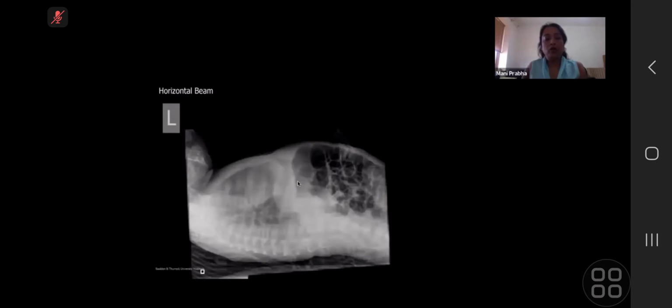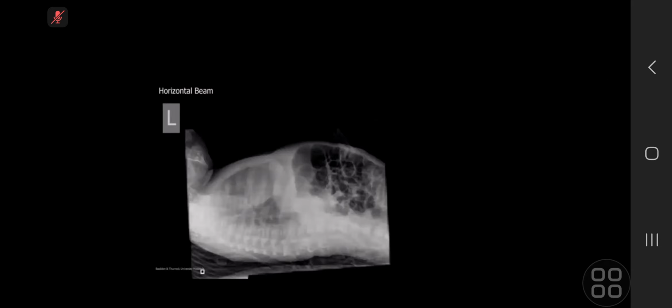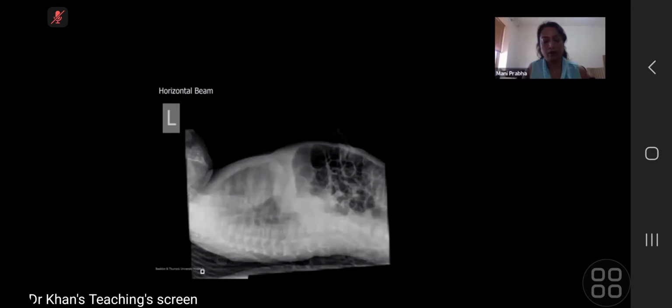Can I take you back to this one? In this one, examiners like to ask what's the advantage of keeping the patient supine, or what's the advantage of keeping the patient in lateral position? Do you know about this? So I suppose the lateral position is useful if you're trying to look for free air in the abdomen or a pneumothorax in the chest. Yeah.